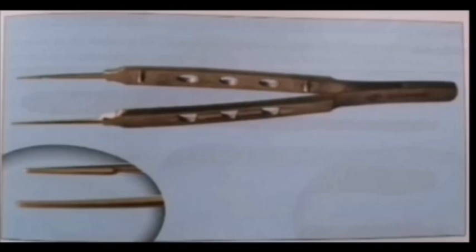So just know the name, corneal forceps. The forceps has very fine teeth at the tip. You can see a bit here. It is having teeth, but very fine, not that prominent. Or you can point it. You can see here. It is used to hold the cornea or scleral edge, okay, after incision, for suturing during cataract, glaucoma, repair of corneal or scleral tears, and keratoplasty operation. So it has these uses.